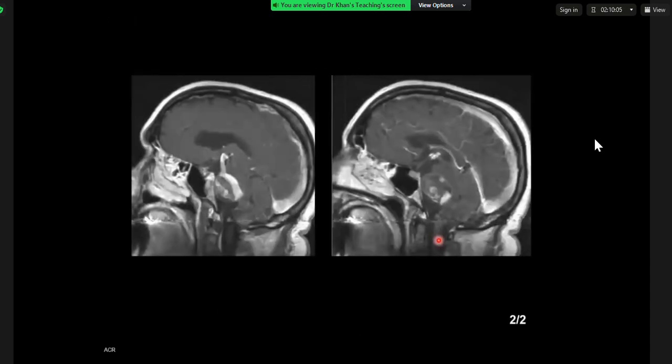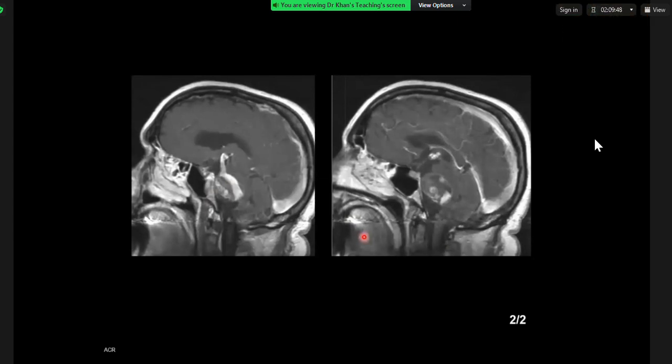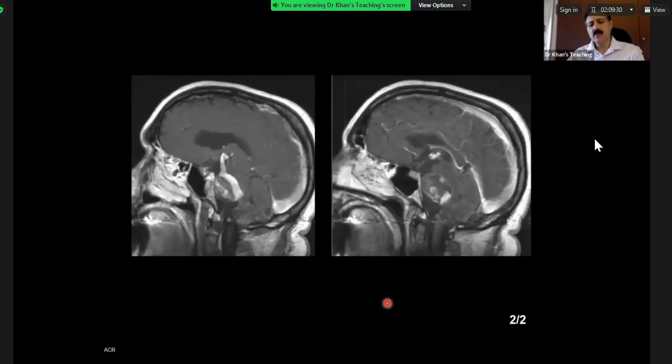Okay. Now, on a contrast enhanced MR, you can see what is happening inside. Can you describe it and what do you think is happening? So on the contrast enhanced sagittal images, we can see that there is high signal likely to be contrast within the abnormality, in addition to areas of low signal more anteriorly, which may represent thrombosis. Yeah. So bizarre is the word.